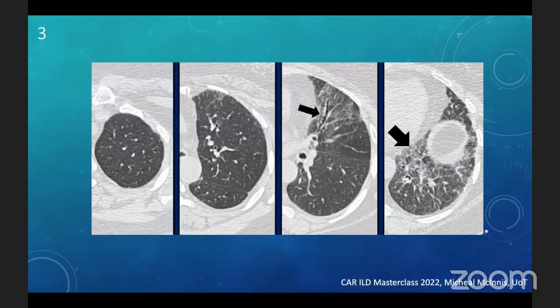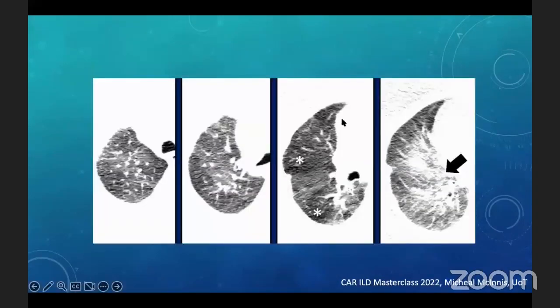So this is a fibrotic hypersensitivity pneumonitis. This is the expiratory imaging, and it shows the areas of hypoattenuation, denoting air-trapped areas of the lung. We can see sometimes the expiratory imaging is really good to see the areas of the central ground glass opacities. They accentuate in the expiratory imaging, as we can see it here.